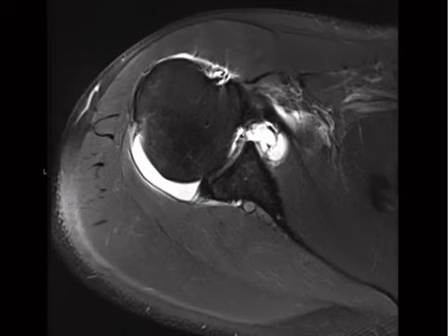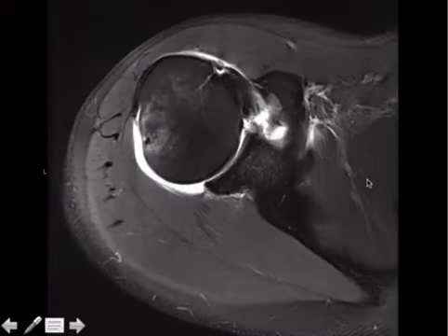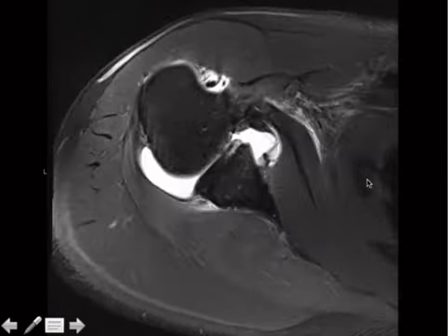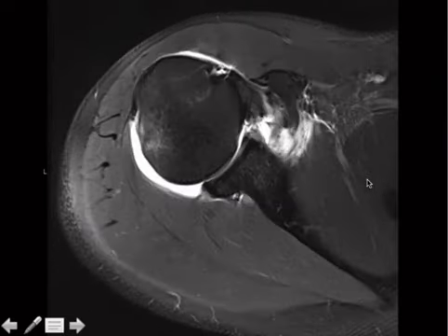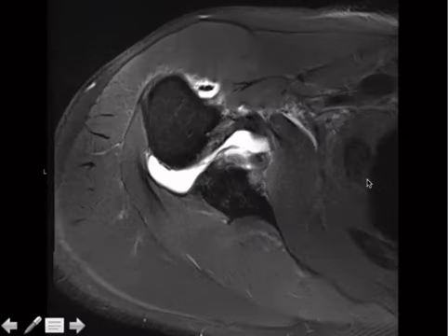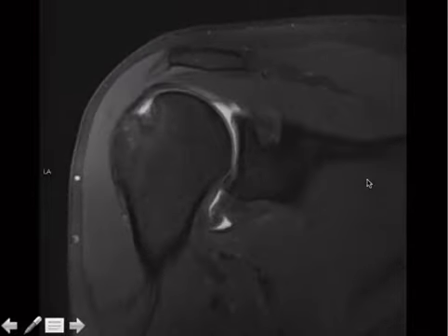We're looking over here. So ripped off and sort of mashed and scarred back. Another plane. That one's less helpful.